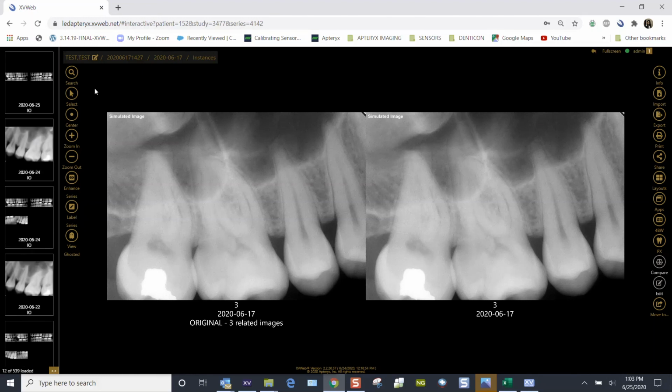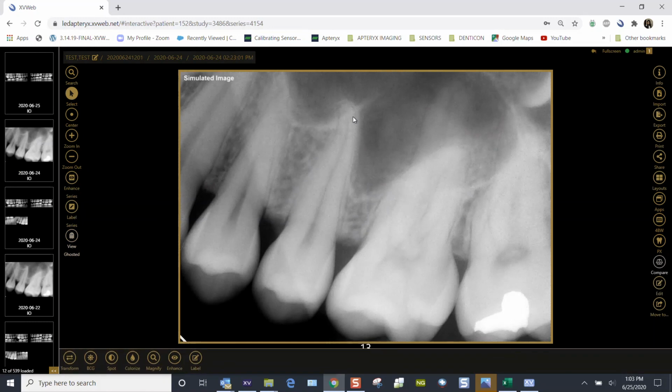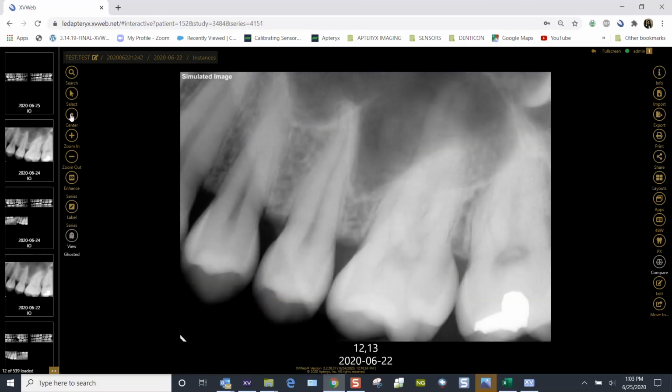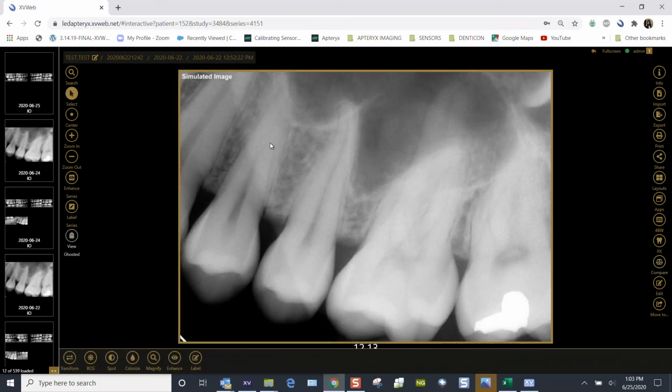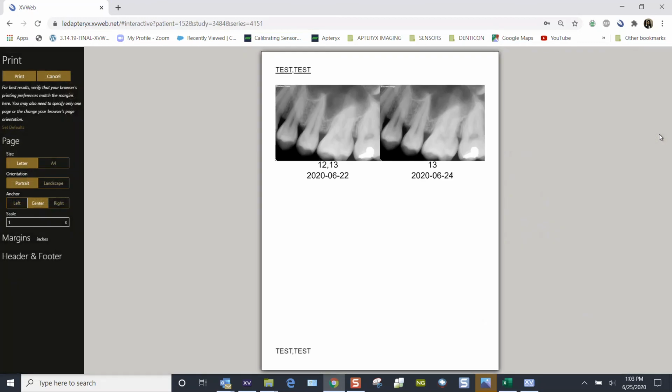So it's really a select and deselect. Click into the date, choose your select button, choose the image. There's 3 clicks there. Turn the select button off. That's your 4th click. Hop into the previous date, turn your select button on, click on the image, and now you can print those 2 different images from those 2 different dates.